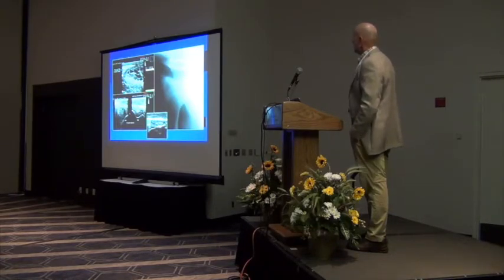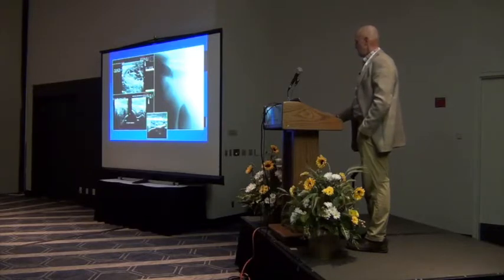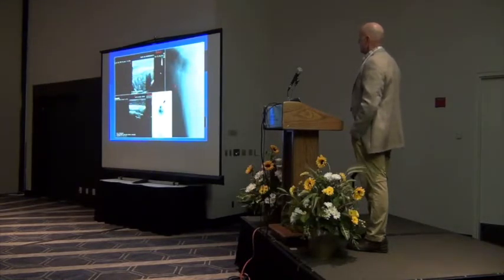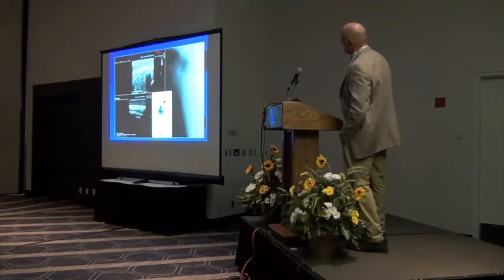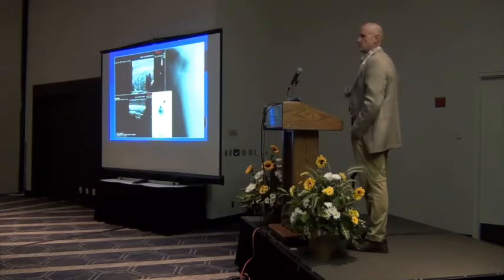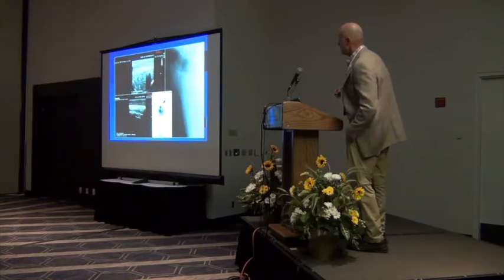And this one, actually, one of the screws started to back out. So I was a little bit worried that maybe that was potentially infected. Well, you can look right down there and see what the soft tissue looks like over that. Now, a lot of these horses will go ahead with a chronic supraglenoid fracture. You can see that it's repaired, albeit in an abnormal position, but they will have a coexistent calcification of the biceps tendon as well. So it's just nice to know all the things that are going on.